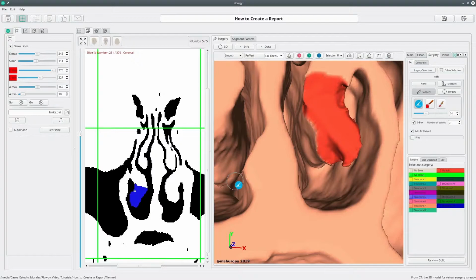If at some point we think we have removed too many layers, we can always add material to the structure by pressing the Shift button and in this case clicking the right mouse button. As we can see, we are now adding new layers on top of those we previously removed.